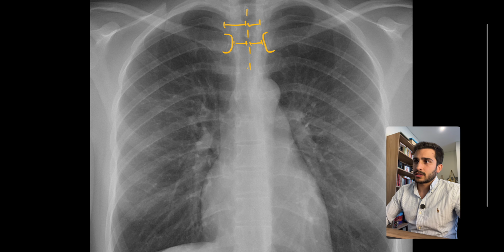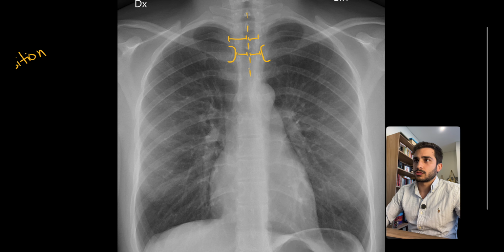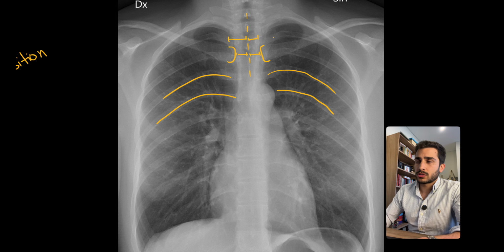And another factor that you can look at is just the symmetry of the ribs. Okay, so is there roughly the same amount of bowing on each side, or is one side really different to the other, aka asymmetric? That's usually another good way if the medial borders of the clavicle don't work. However, it is worth noting that if there is a severe scoliosis in the spine, particularly the mid to upper back, mid to upper thoracic area, then that would also distort the ribs in this case. So looking at this particular X-ray, it doesn't look like the patient was rotated in any significant manner.